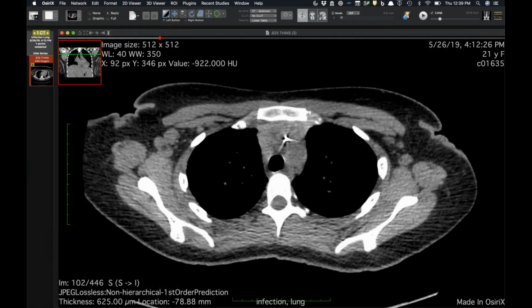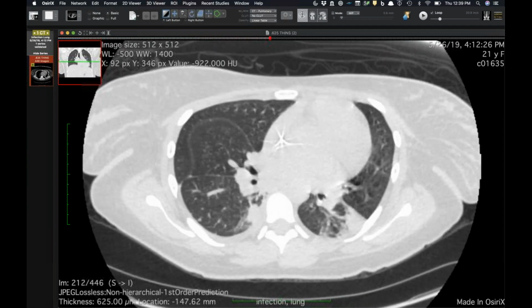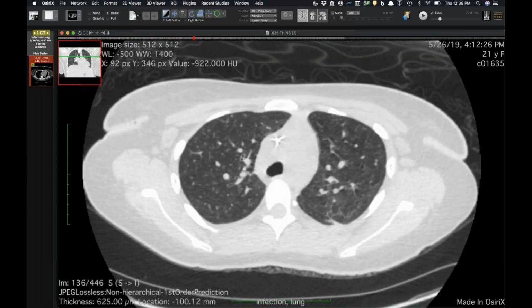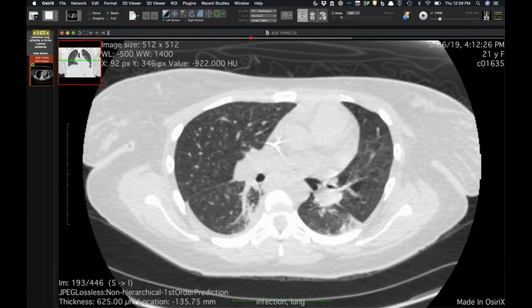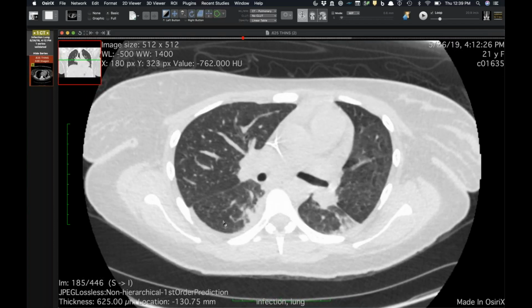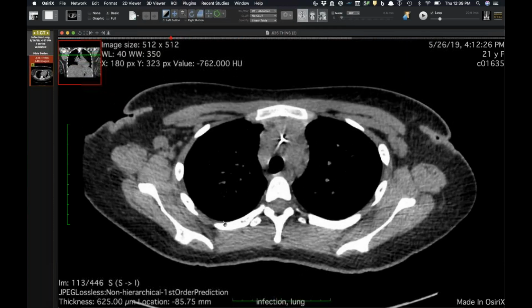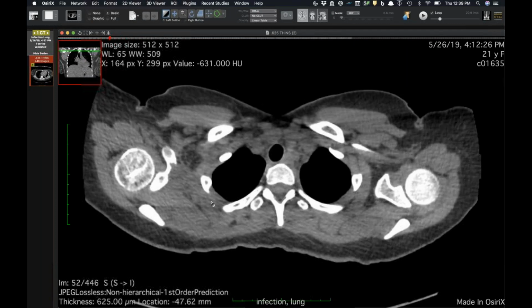This is one where you'll see this is a very young patient, and this is something that fools us every once in a while. This patient has a little bit of consolidation in the lower lobes, and there's some volume loss here. They already have a PICC in place, so some of this may be atelectasis, maybe a little bit of aspiration, but you can also see that they have innumerable tiny little nodules studding the pleura in a random distribution. So it looks like some sort of miliary spread of something. And you can see they have big bulky adenopathy in the lymph nodes.